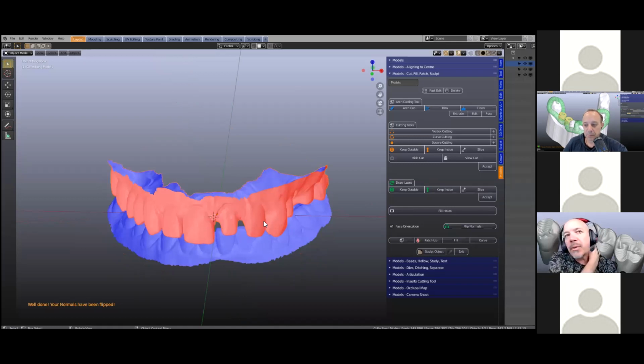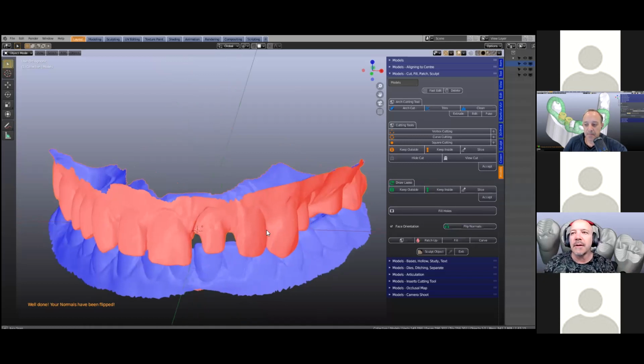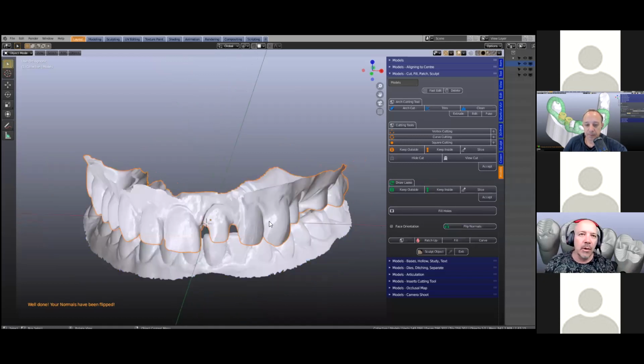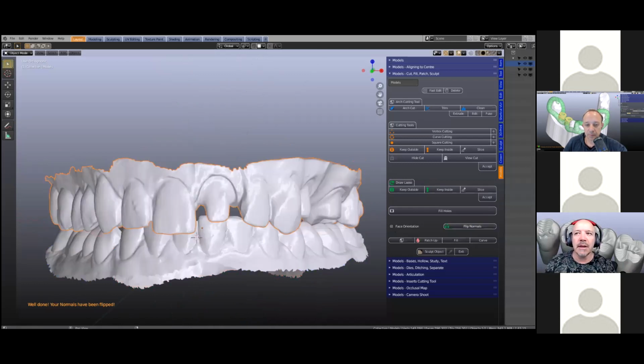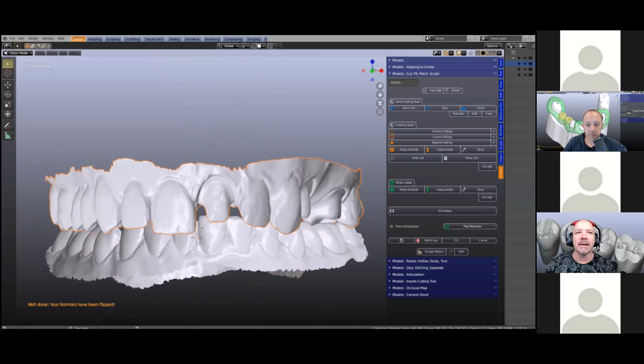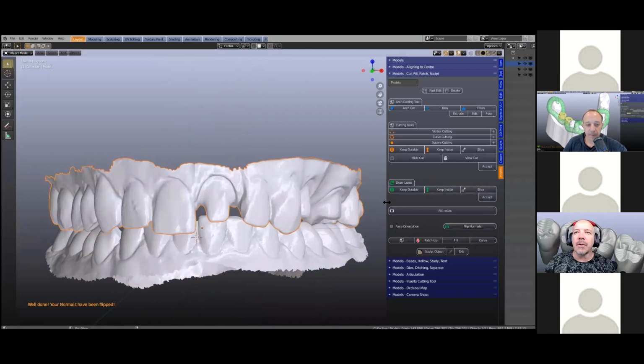So forget about it, because when you're doing arch cut and anything else, everything is inverted. A Boolean cut will be a Boolean union. So it's all positive and negative. Everything is opposites, so it's not going to work. With a trained eye, you will quickly see that the shading is different, so that'll appear very fast. All right, so that's good.